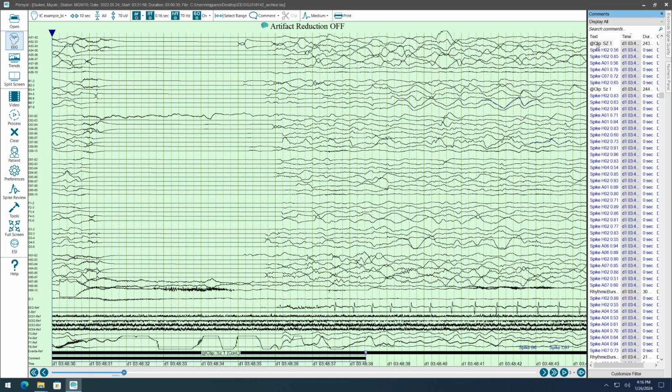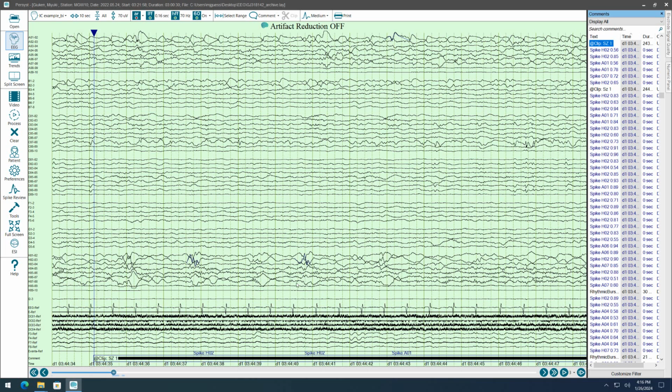And if I click on it, it takes me back to the beginning of that comment. So I've marked a comment with the duration. And the difference between comment and clip is when I selected clip for that range, I place that at clip at the front. The reason we use that simple is when you alphabetize a list, it goes to the top. Makes it easy to group them together.